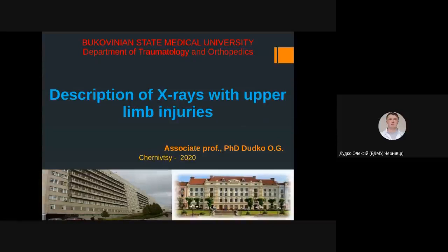So actually we need straight views, AP and lateral. We need a good quality of film. We need a long film X-ray, and as well, if we're talking about a two bone segment, it's better when both joints are involved on the film.